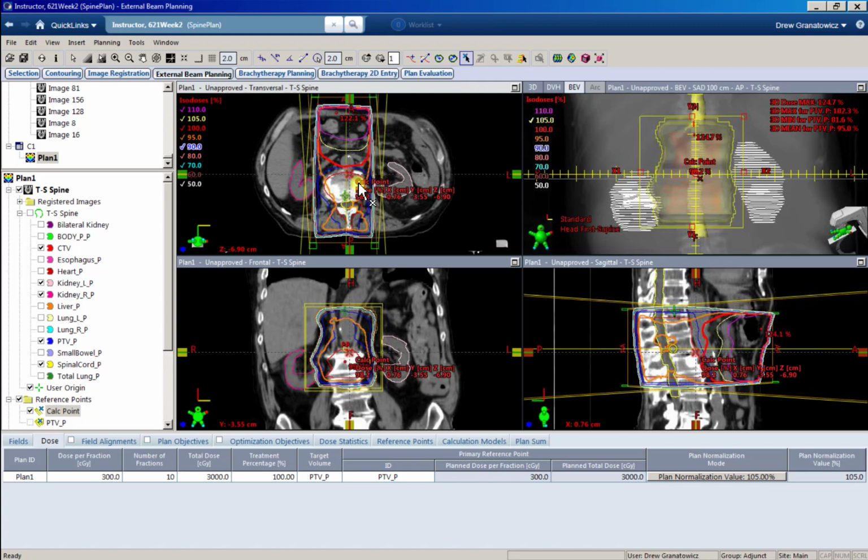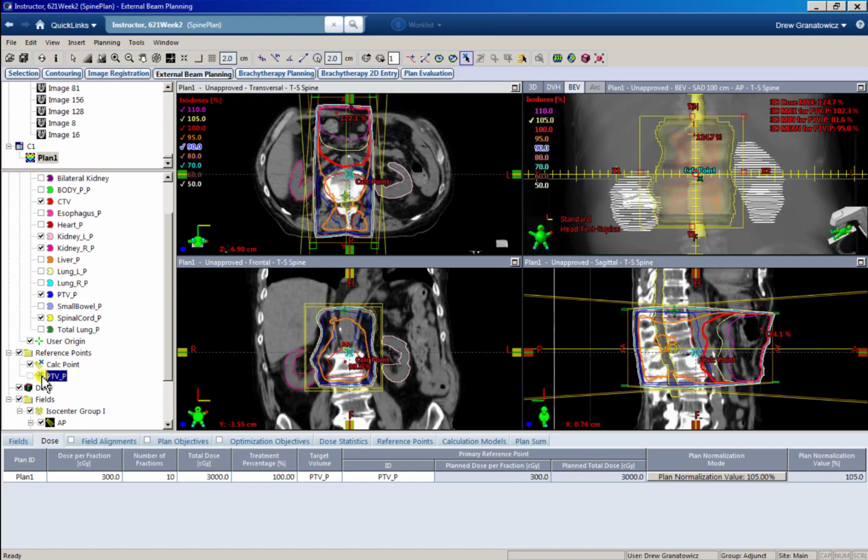And now you can immediately tell the difference between a virtual point and a physical point. The virtual point has a slightly different picture: that bluish cross is inside a yellow square on a virtual point, and it's not on a physical point.